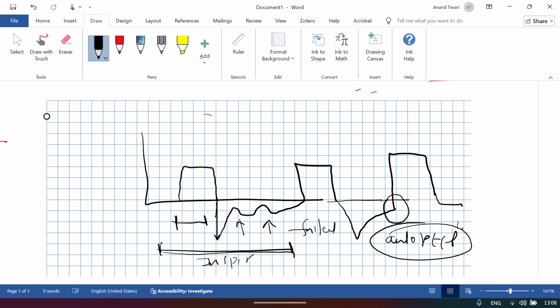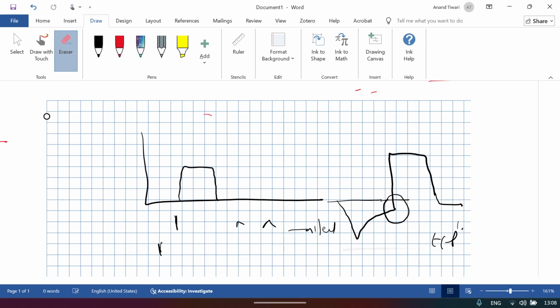So you don't need to press the expiratory hold button to see the auto-PEEP on the pressure time curve. You can easily see it in the expiratory limb of the flow time curve without pressing any button. If you see that there is an inspiration before the expiratory limb touches the baseline, there is no complete exponential decay, and that will give a clue that the patient has auto-PEEP. So these are the two very important curves, pressure time and flow time.